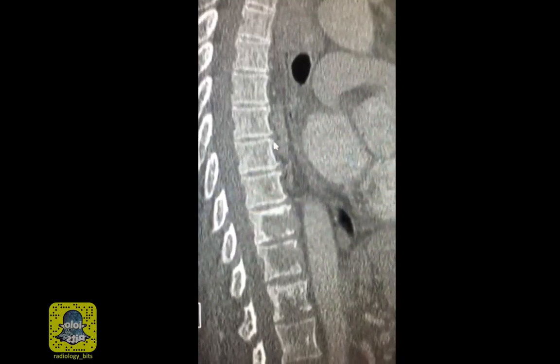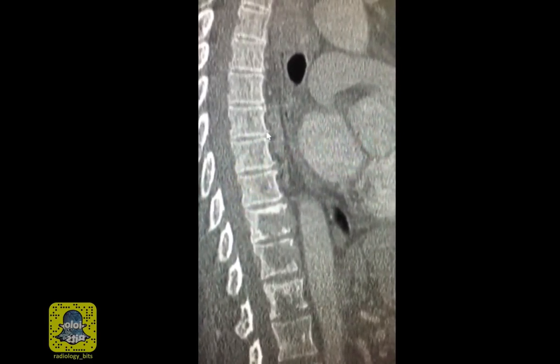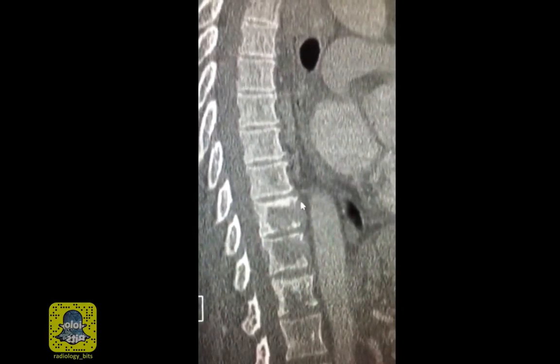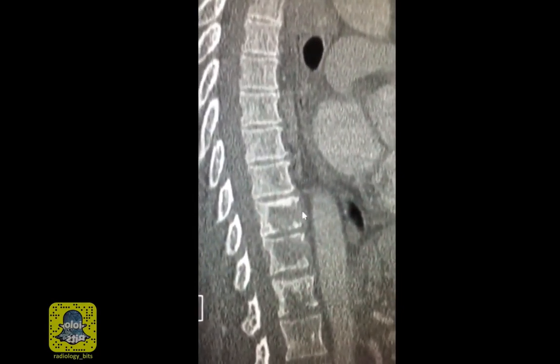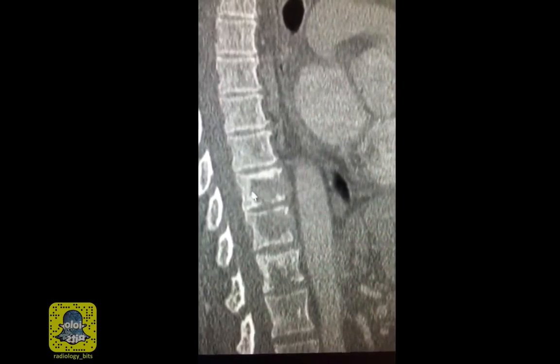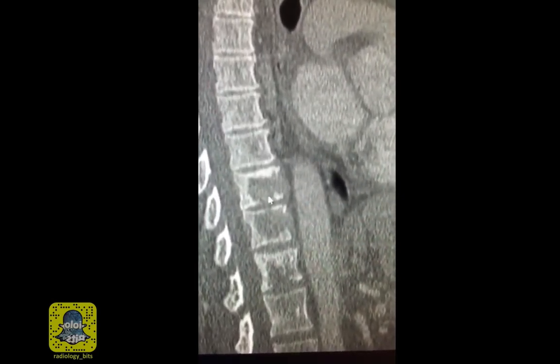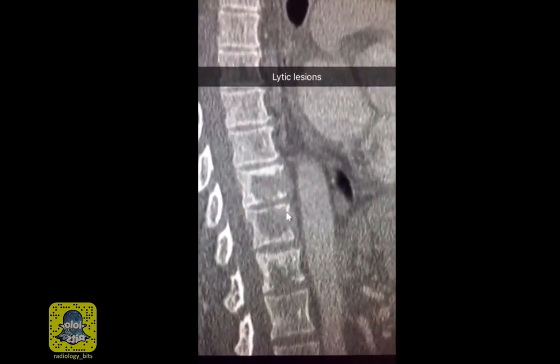As seen on the chest radiograph, you have some minimal degenerative changes in the form of osteophytosis here. But more importantly, the areas that you questioned on the chest radiograph, although difficult to see there, are much easier to see here. You have a lytic or dark lesion that destroys the anterior cortex in this vertebral body. A similar lesion is seen in the vertebral body below it, and even more lesions are seen here.